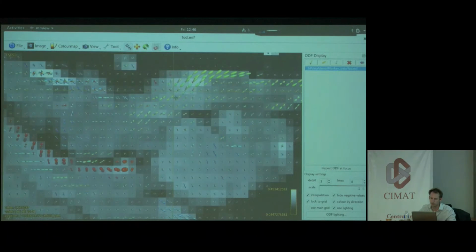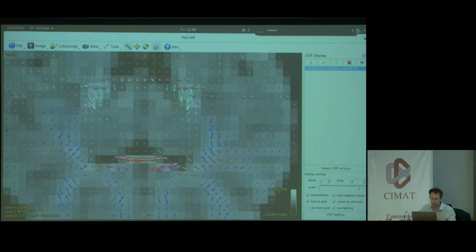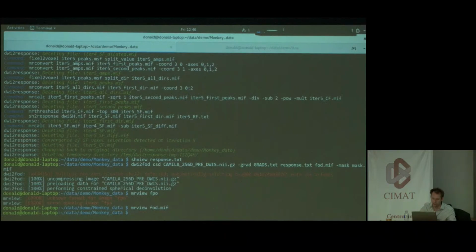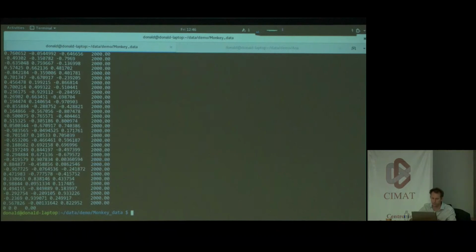Okay, so inverting the Z would be the wrong thing to do because that's looking right. That's the pons, right? That's the brainstem. So in that plane, that's looking like it would be right. If I inverted the Z, that would completely screw up the brainstem. So going back to that coronal view, what I want to do is invert the X. Okay, so this is fun. So I've got these, what are they called? Grads. So at that point, you have to just, yeah, have fun.